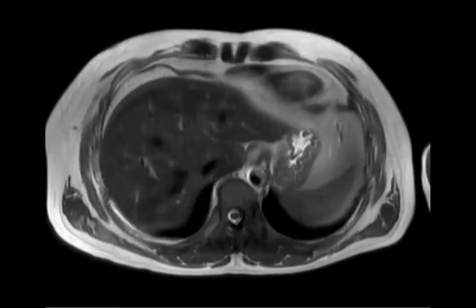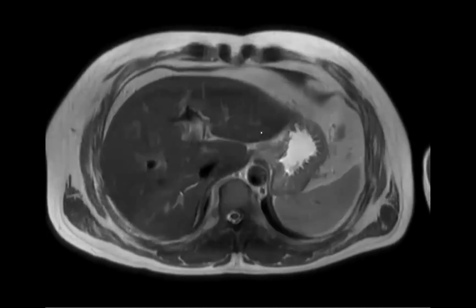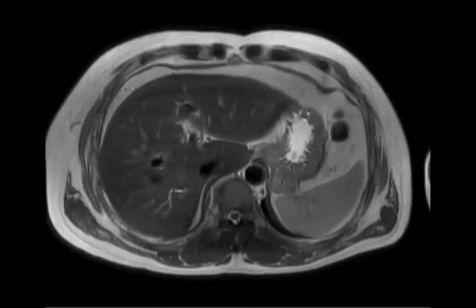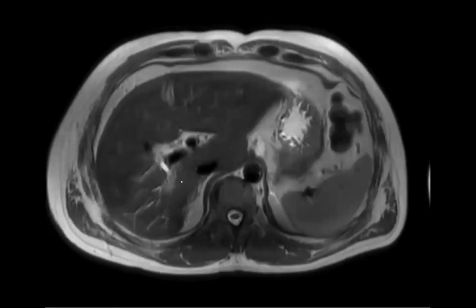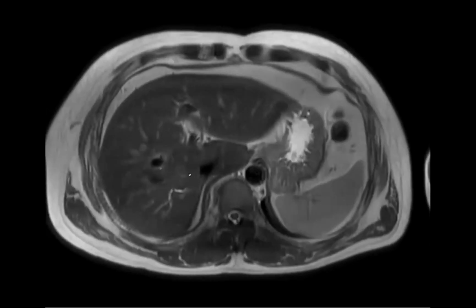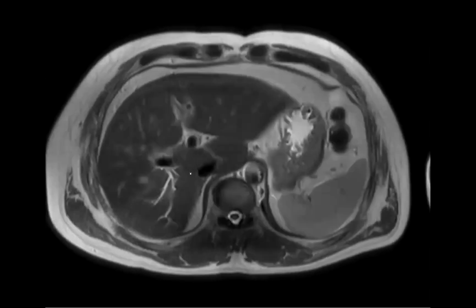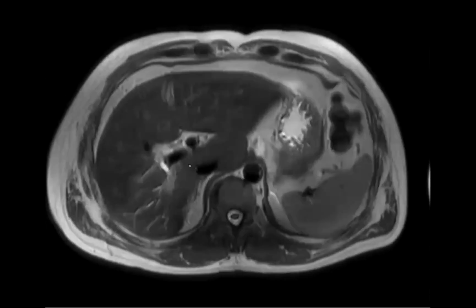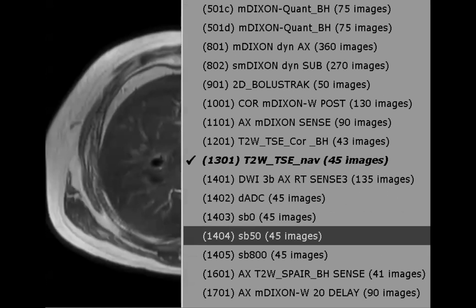All right. So the next case is one where the finding was not described, was missed. The liver, the hepatobiliary area, was reported as normal. Any thoughts? Looks like focal buildup in the right lobe, and I don't see the bile ducts in the left at all. Right, the right posterior duct is quite different from the rest of the biliary tree.